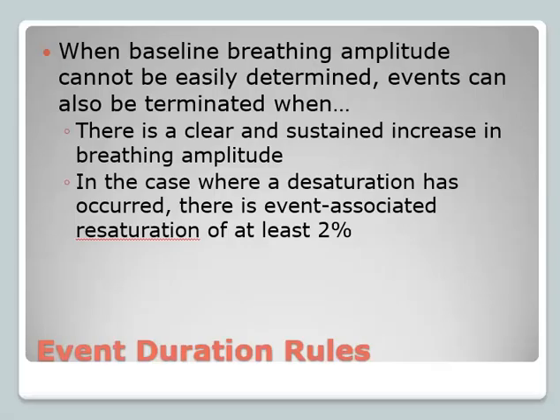Well, you can either end scoring it when there's a very clear and sustained increase in the amplitude of their breathing, or, if there's been a desaturation, if their oxygen level dropped in response to this respiratory event, you can end scoring it when their oxygen comes back up by 2%. That's where you can end it. These are just in-case rules. For the most part, you can use your clinical judgment on where to stop scoring the events if it's really hard.